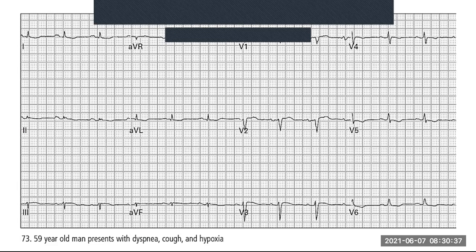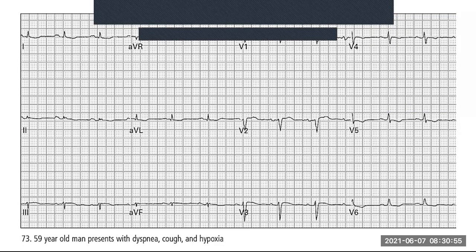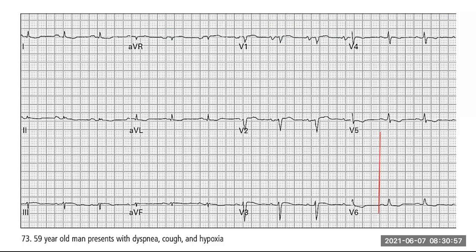The first thing we're going to have a look at is the axis. Does anybody here remember how to do the axis? Shall I do it for you? Very good. So we look at lead one and aVF. Let's just draw it out over there. Let me get the annotations going. Sorry. Let's just do it like how we do it every time. So that's our little grid. For axis: normal, left, extreme right, and right. Sorry, somebody was saying something on Zoom. Couldn't hear you.